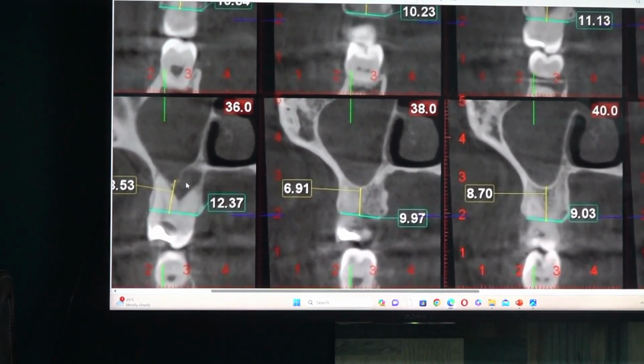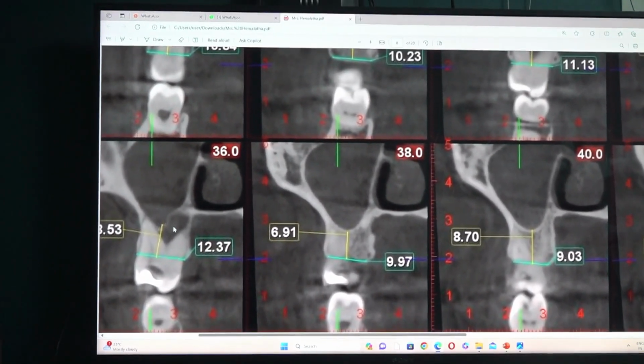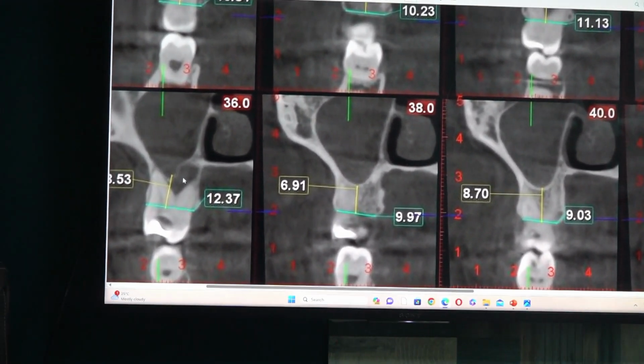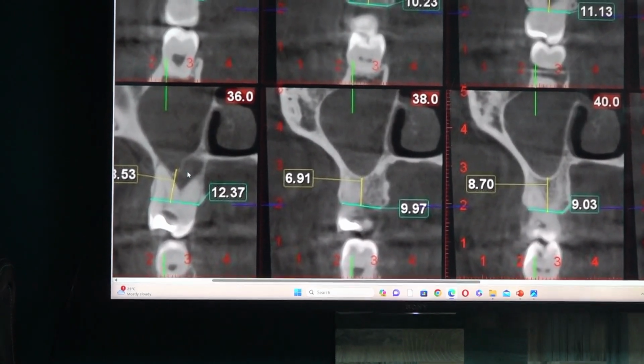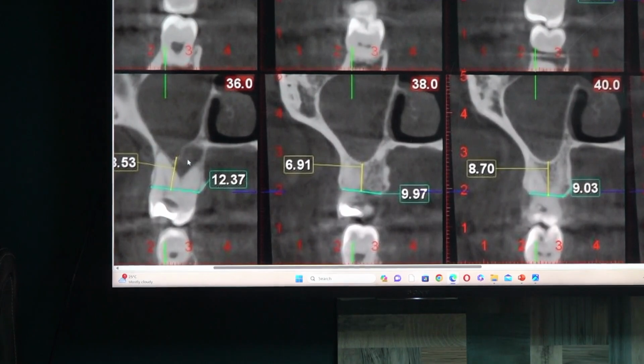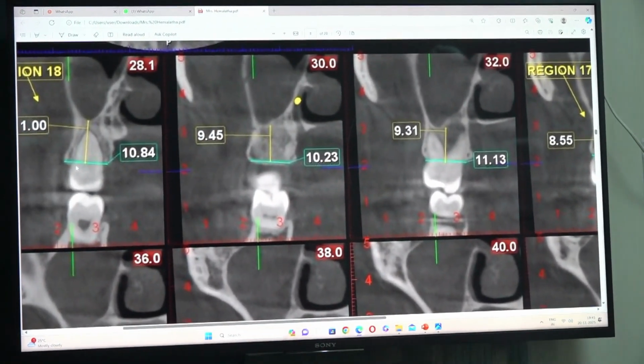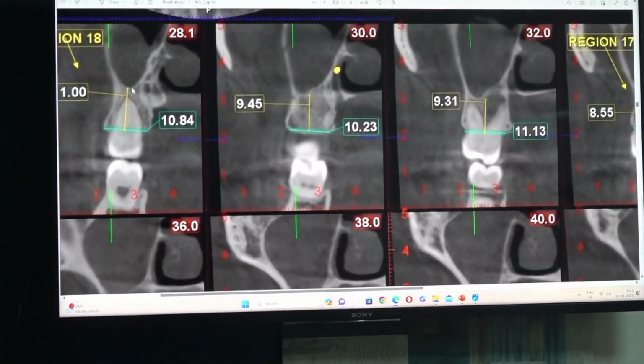Even if the stability is less, you don't have to worry if you are doing welding. Or if you don't want to place implant in the palatal socket, you can anyway jump into the mesiobuccal palatal area, mesiobuccal root you can select. Okay, this is for the 7. These 3 implants are enough, but if you want to add some more stability, you can place a pterygoid. Pterygoid cross section is not available with this report.